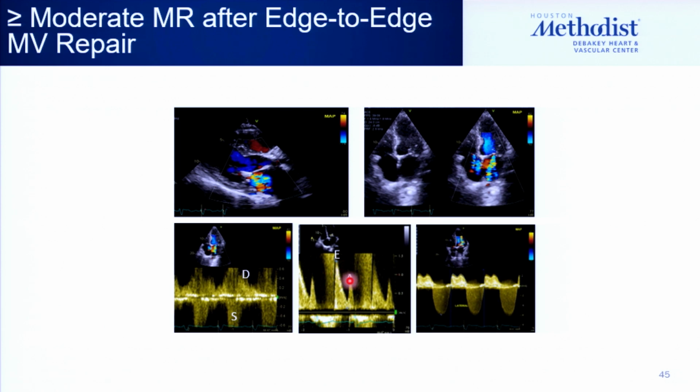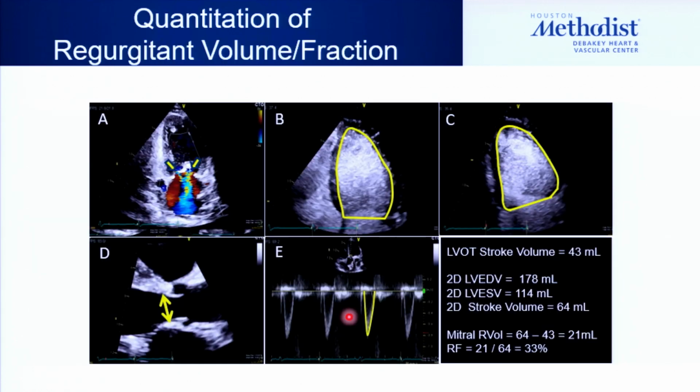If I see an inflow like this of the mitral valve, I get concerned, right? In somebody who should have a grade 1 diastolic dysfunction and regurgitation. So you need something else. Now, by Doppler, your only other method to quantitate regurgitation is volumetric of the ventricle. Why? Because I have a prosthesis here or a clip here, and I cannot measure flow coming through the mitral annulus. I have to measure the total volume and ejection stroke volume of the ventricle.